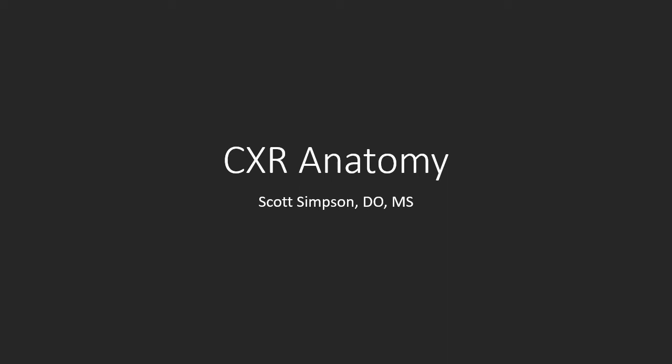So this lecture is just going to touch really quickly on some basic chest x-ray anatomy. This may be a review for some of you, but I think it's really important to at least watch during your first rotation so that you can feel up to speed when you start looking at chest radiographs.